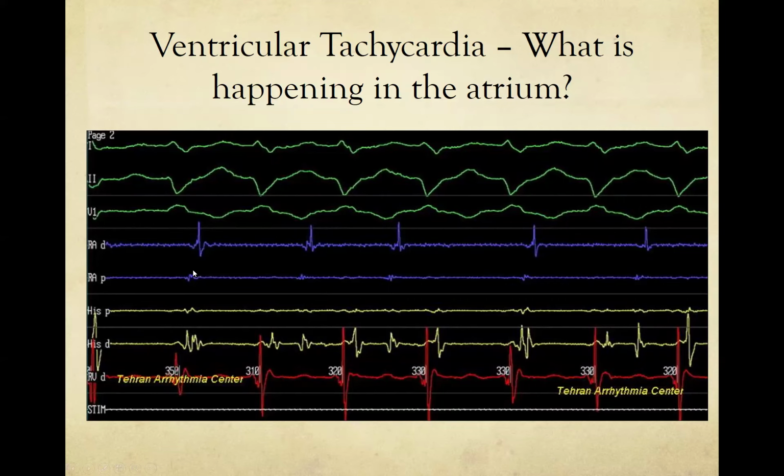But this is all a long way of saying that it's a good question you're asking, because you're basically asking, why are they displaying the proximal right atrial electrogram at all, since you've probably never seen that with Barry or me when we do EP studies? And the answer is it's very idiosyncratic in my experience.